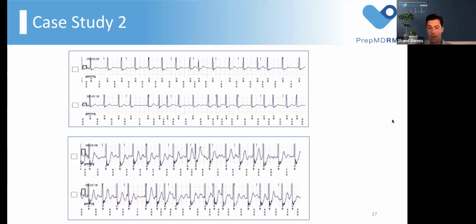So this is likely AFib. We like to use that umbrella term. The patient was not anticoagulated, so we escalated this to the clinic. And then within a few days, they had a prescription for OAC. All right, great. Thank you, Shannon.